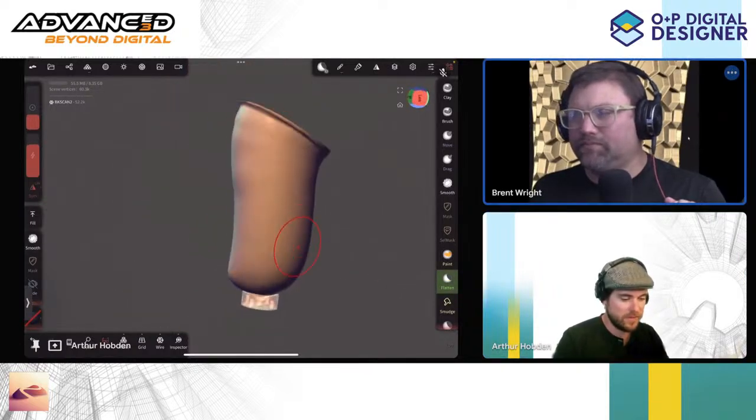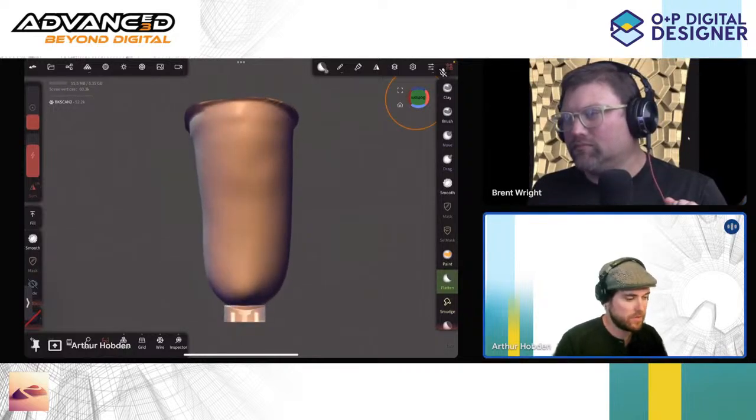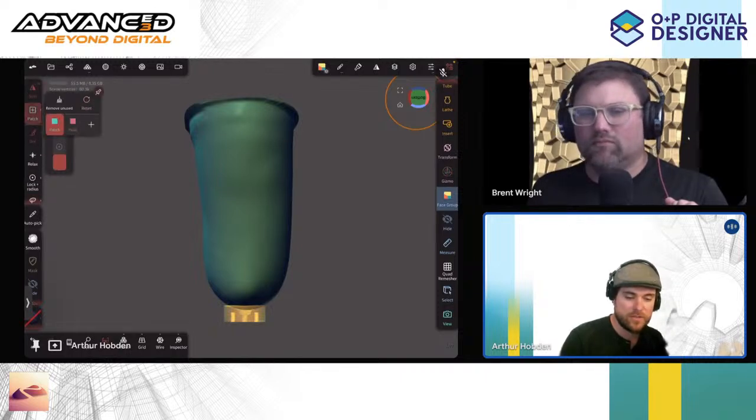Yep. Sweet. So now we're going to draw trim lines. Trim lines are best done with groups because we can control our quad meshing with groups, and they have a face groups tool, which is really awesome. You can do things like draw and also lasso rectangles, ellipses to make these groups. And you can choose your colors for groups too. So we have colors right now.